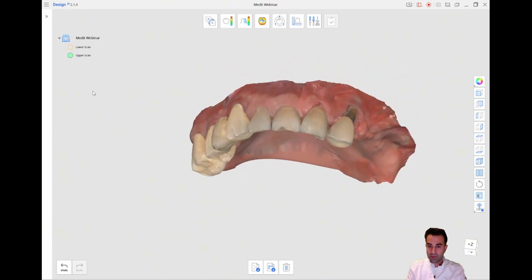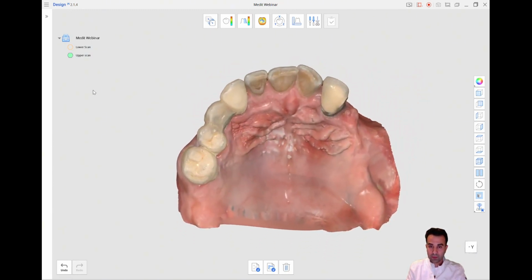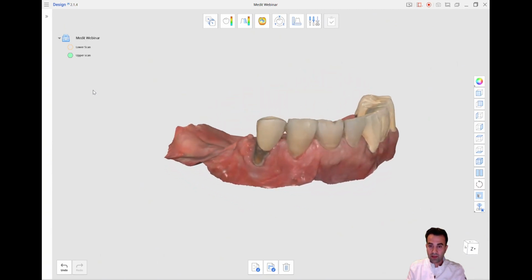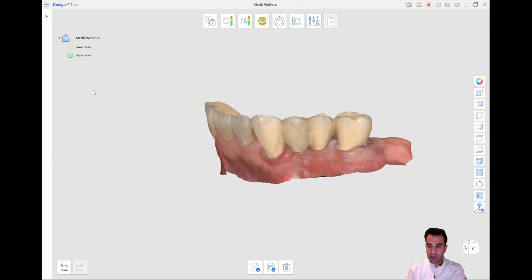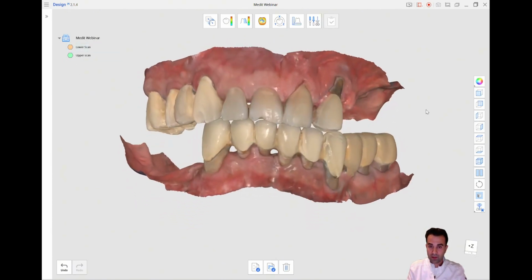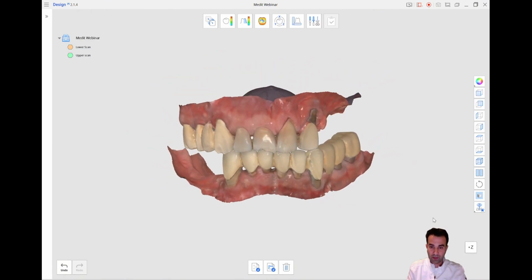The decision was made to extract the teeth and insert an immediate denture, and possibly in the future that denture will be converted to implant retained or supported.